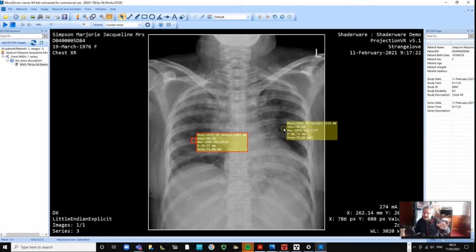So we're going to have a lot of different pixel numbers in here, but they all approximate to an average, which for lung tissue is obviously a darker black than for rib and lung tissue combined.